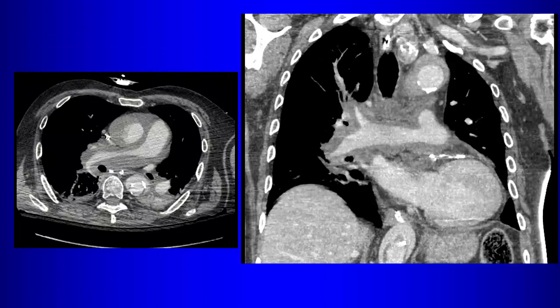Yeah, so now what about this intramural hematoma? It's also in the pulmonary artery. Yeah, so we do have intramural hematoma here involving the ascending aorta, but there's extension to the pulmonary artery. Notice the narrowing of the pulmonary artery. This can also be a complication of intramural hematoma: if it extends onto the pulmonary artery, it can narrow the pulmonary artery and impair the flow of blood to the lungs.